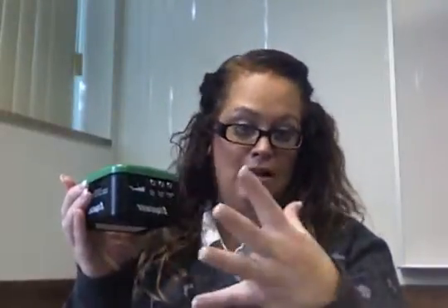So this is a communication device and it's called the sequencer, and on here you could also plug little devices in to make it louder if the kid needed it to be louder at the time, or plug a mic in or whatever they would need.